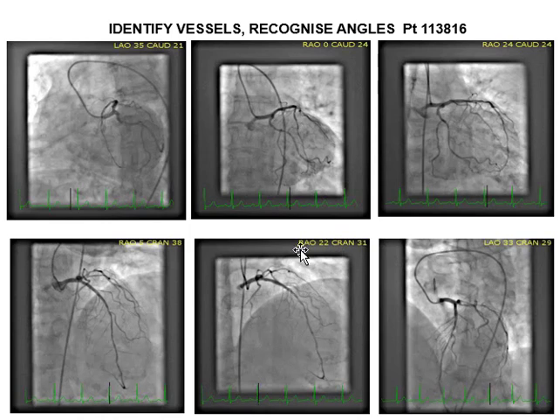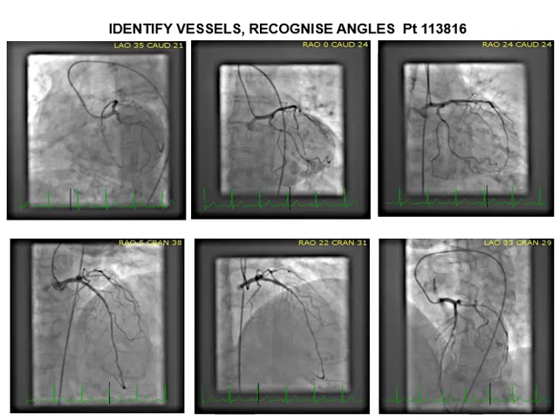And again, RAO cranial for the LAD. It shows you a good view of the proximal segments. And the LAO cranial here, just a slightly different angulation that tilts the heart a little bit more forward and separates the circumflex a little more out. I think this is a better view. Everybody has slightly different anatomy, so the same views don't always apply. I'll just go back to the previous slide.